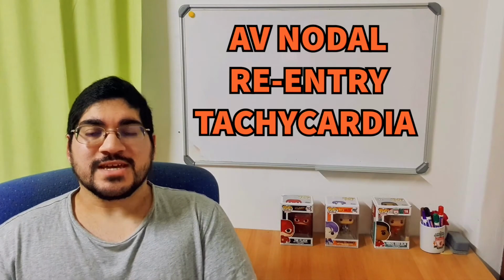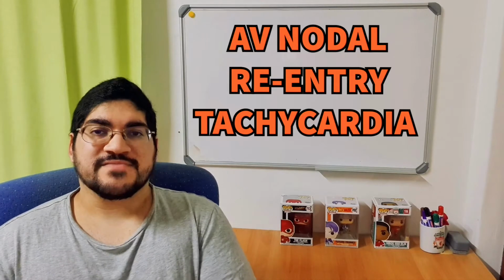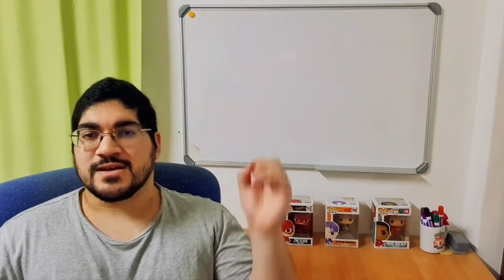The next one in our regular narrow complex tachycardias is AV nodal re-entry tachycardia. What that means is, like when we spoke about heart blocks and pre-excitation syndromes, specifically when we spoke about pre-excitation syndromes, we said there was an abnormal connection between the ventricle and the atria. So the impulse is no longer coming from the SA node through to the AV node and all the way through. An impulse came from the SA node to the AV node, but then the AV node sort of kicked off an accessory pathway and things just started circulating. So that single impulse keeps circulating from the AV node to the ventricles, back to the atria and all that.